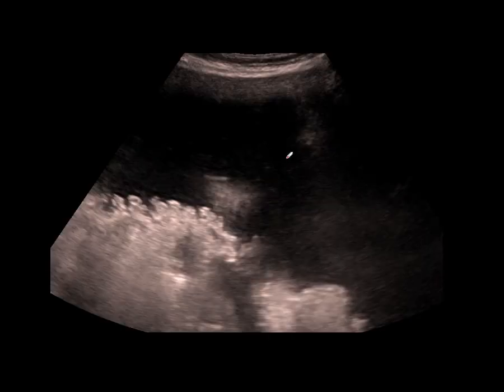And we're just getting on now to discuss omental tumour, which, as we said, omental and peritoneal tumour is the natural spread pattern of ovarian carcinoma. We'll talk about it more in a later video, but just to show you, here's a transabdominal scan, quite a lot of ascites, and here we can see some omental tumour. I'm just going to draw on it here so you get an idea where it is. So that's probably our omental tumour here.